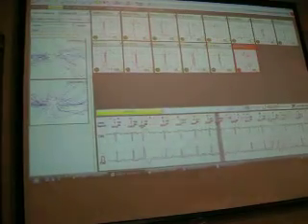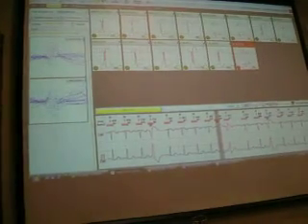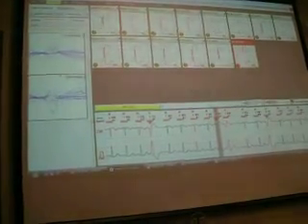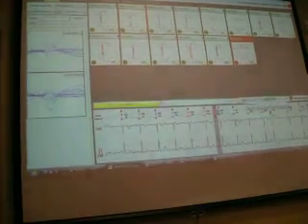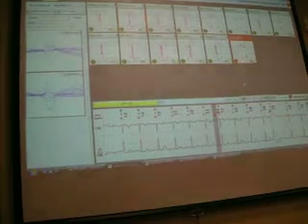And this is the last, which has some problems, and I show a new function, how to use the fixed button with this cluster.